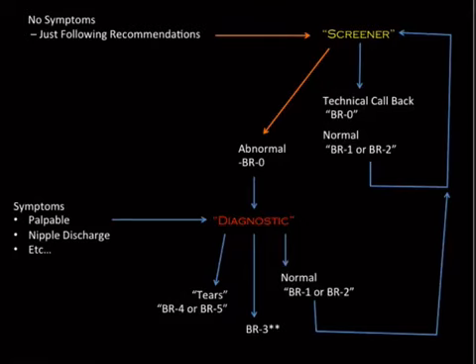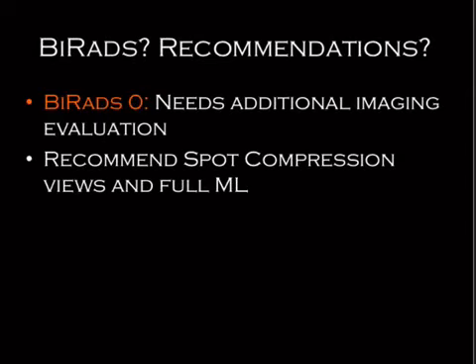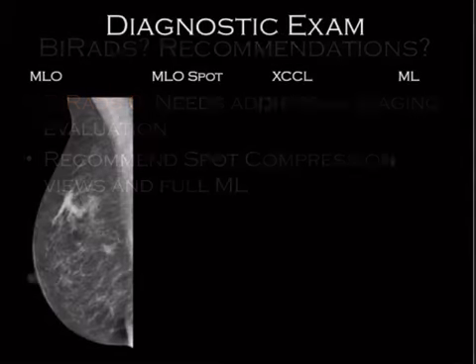So we had a screener. We called it abnormal. We said there was a finding there, so now we're in the diagnostic pathway. So this was a BIRADS 0 because we said it needed additional information, and we're going to get a spot compression and a full lateral because we only saw it in the MLO.